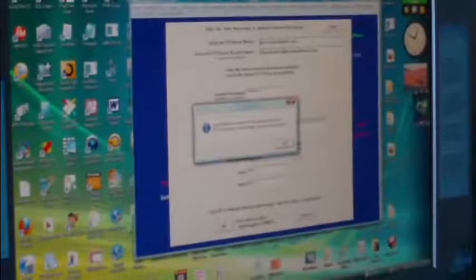Clicking on OK, and the internet connection went to this website. It found this FTP server account, and it indeed had this password. So we have a good connection to this FTP location at this point. It then searches at that location in the server account folder, patient folders, for a folder of the name patient folder 666.